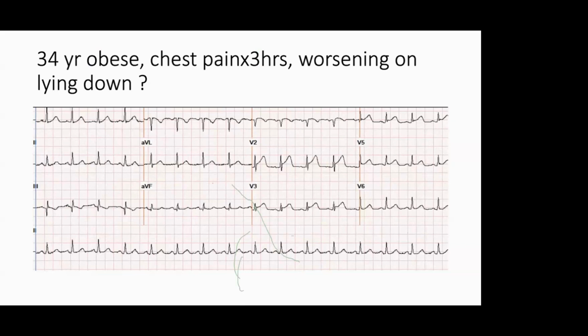Can anyone unmute and tell the findings? You can tell just about the T wave, ST, QRS height, all those things.